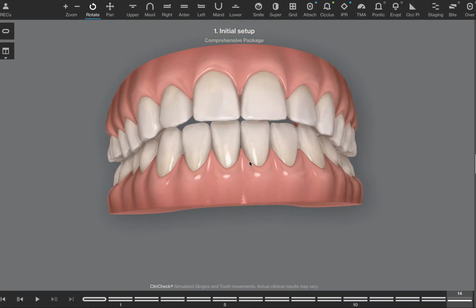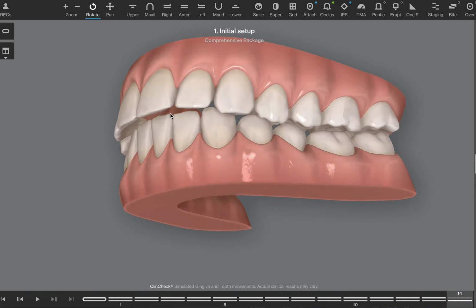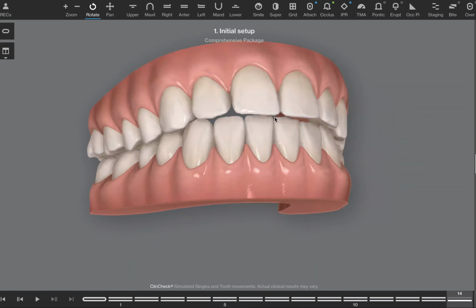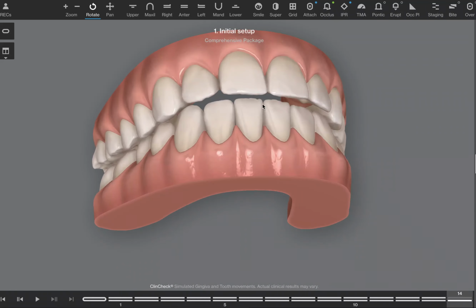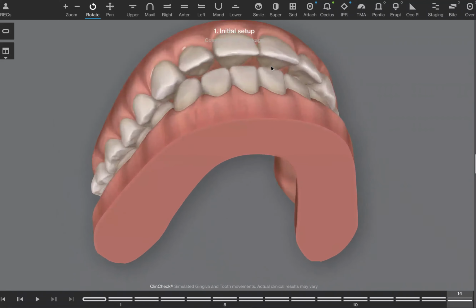So that was their first attempt. When I say they are technicians, they're not dentists. So they more or less just line them up so they look good. Once I get the data from your sleep study, I'm going to determine how I want to resolve the rest of this. But essentially, I want to get rid of this overjet right here.